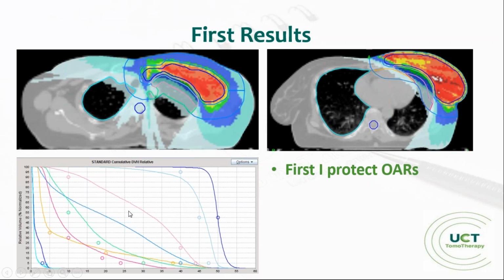I try to find out what the planning system can propose to me, and I'm trying to do my best, all I can, while my PTV coverage decreases.